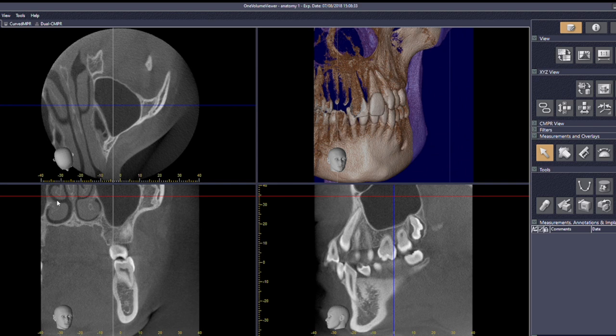The other anatomy we can see here is the nasal cavity. Now, I wouldn't worry too much about the nasal cavity because it's a specialist area in itself. Just so you know, these are what turbinates look like. So they're the inferior, they're the middle, and then we've got a septum down the middle. And it's totally normal to have one side which is open and freer. And see there's much more black air here versus this side, which is far less. This is a normal thing called nasal cycling, and often one nasal passage is wider and more open when compared to the other.